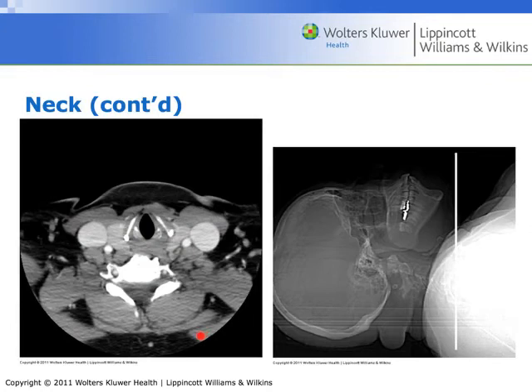Trapezius muscle. Really clearly we can see a right vertebral artery, highlighting very nicely because of the contrast. That's the right common carotid. Right common carotid, left common carotid, and then the pharynx.